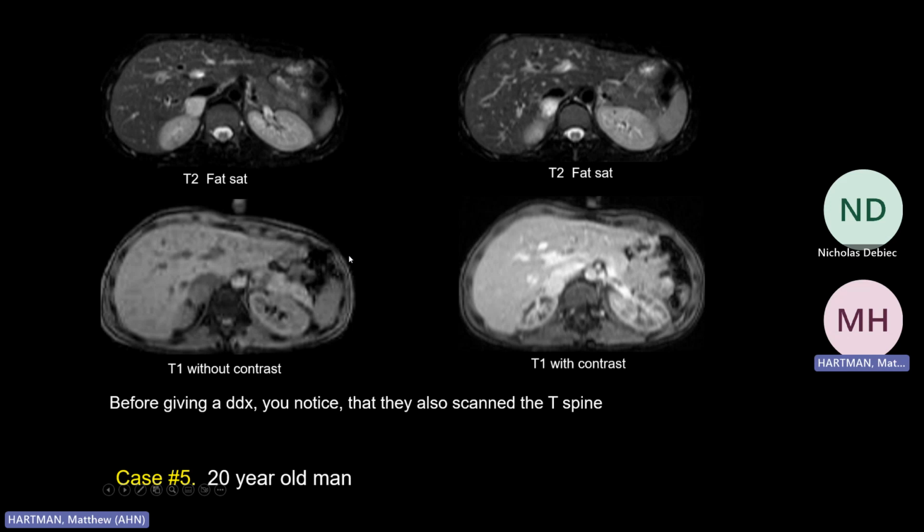So here's another case, like MRI. Let's go through it. We have a T2. CSF is T2 hyperintense. There's no fat, so the fat has been saturated out. The fat is low signal here. We have T1. CSF is hypointense. And then we give contrast. The aorta lights up. What else is lighting up? This adrenal lesion right here, which is also T2 hyperintense. And if you remember our pearl, the chameleon, think pheochromocytoma.